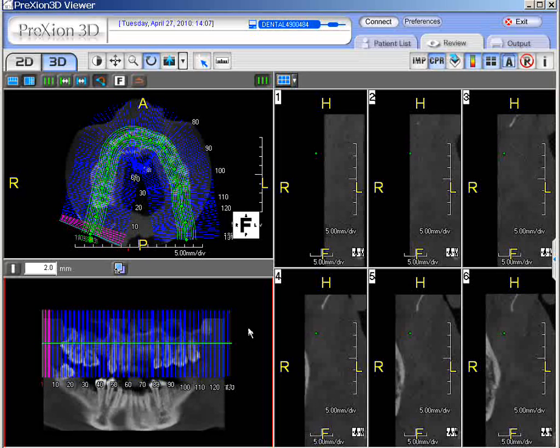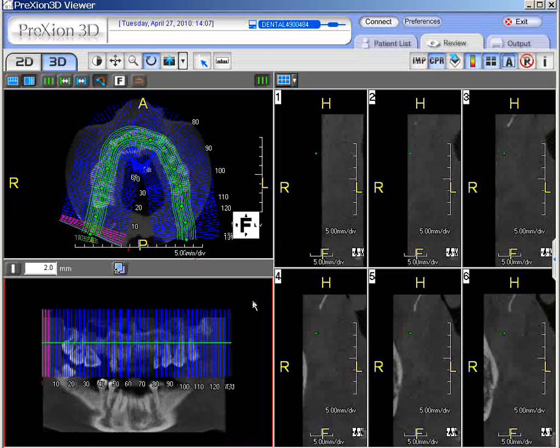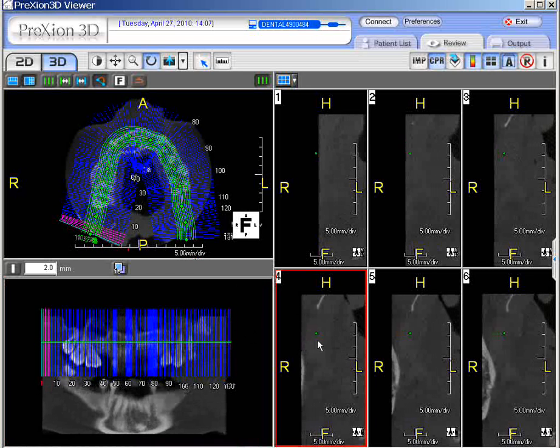I'm scrolling the wheel down once and changing it. It moved toward the lingual portion. Okay, so it's applying it as well. And you can see the little green dot over here. Now let's pick a tooth here.